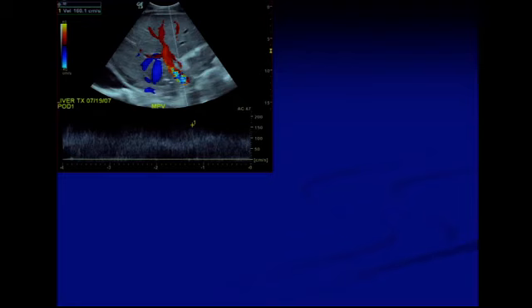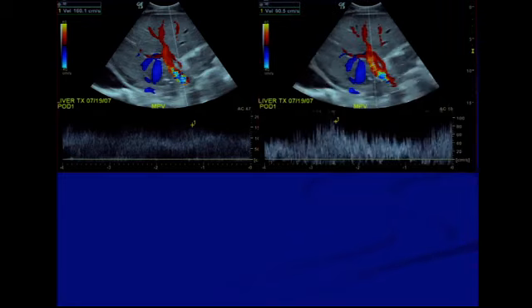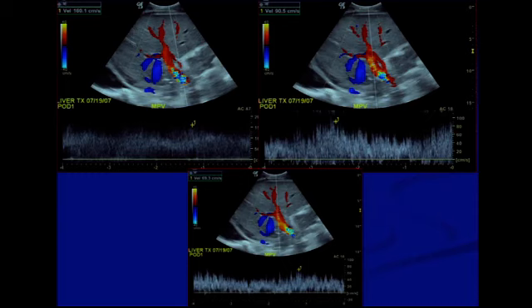Returning to the portal vein, here's a patient with turbulent high flow velocity in the portal vein at the hilum and more distally to the hilum, something which we expect to be normal in the early postoperative period. If we see it later, several months after transplant, then we may suspect a portal vein stenosis, which in fact in this particular case was.